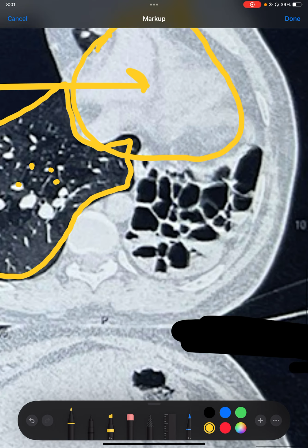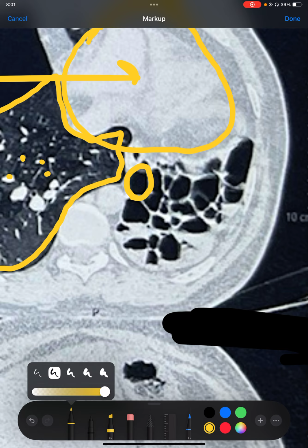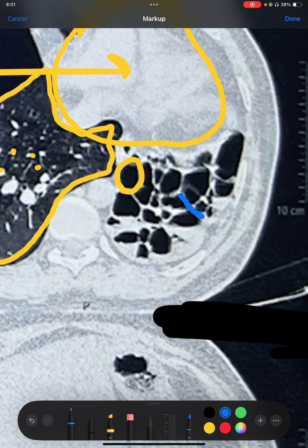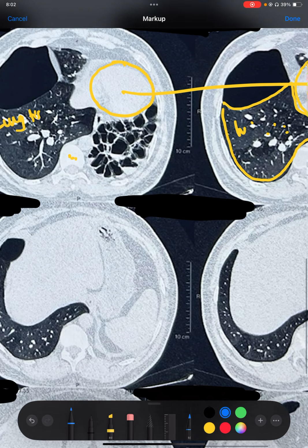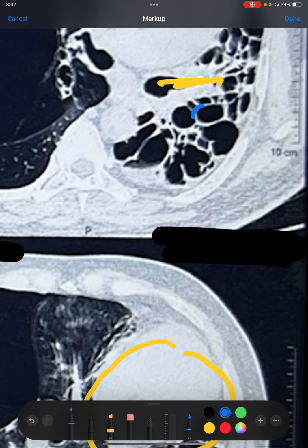And on this left lung, where the lung should have been there, there are some cystic lesions with a very thick fibrotic lining. So this dense white, these are definitely cysts. These are definitely cysts which are thick walled, and this dense white fibers or this dense white lesions, it is all fibrocystic disease. Means these are definitely cysts for sure. So we'll be labeling this as cystic disease.